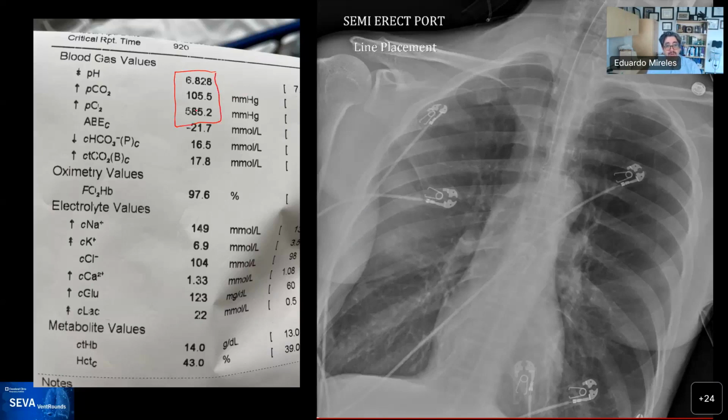There's no subcutaneous emphysema, but this is what we're seeing right now. So I'm just trying to frame you in which you see hypercapnia and enlarged lung fields. Immediately your brain activity should move towards this patient having an obstructive process. It could be status asthmaticus, or it could be that they have a kinked ET tube, but this is the classic finding.